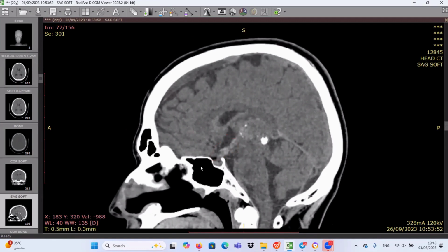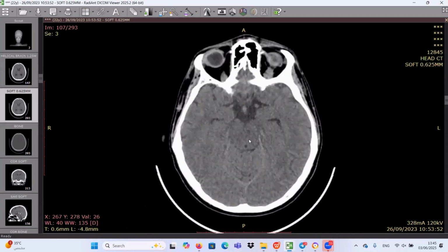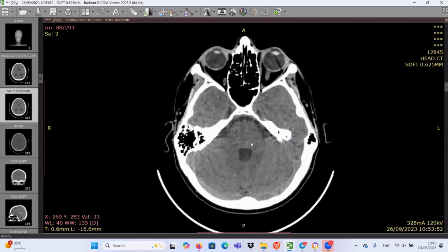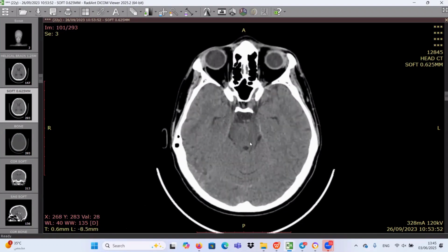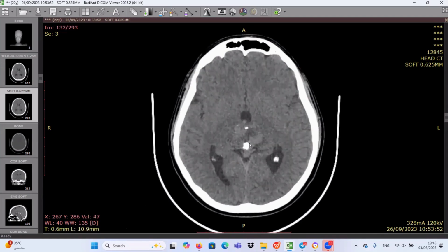What do you think this one could be? It could be another germ cell tumor. Maybe. Or maybe CSF seeding itself. Maybe autoimmune hypophysitis. Because this one is a characteristic location for leptomeningeal metastasis. I think also we should comment on the orbits. No retinal masses. No mass lesion. We don't have any evidence of retinoblastoma. Yes. Or evidence of previous retinoblastoma.